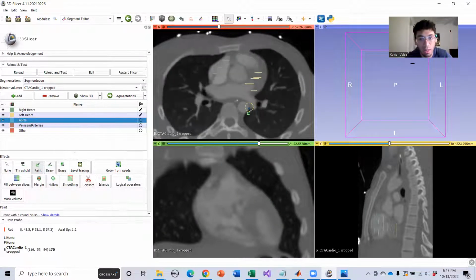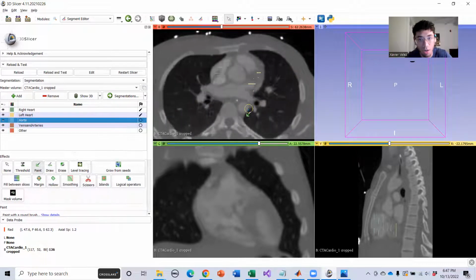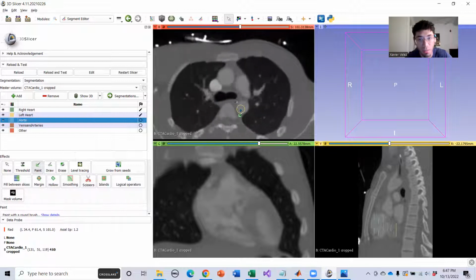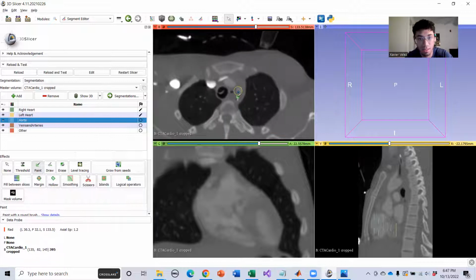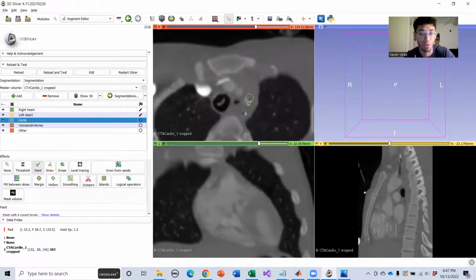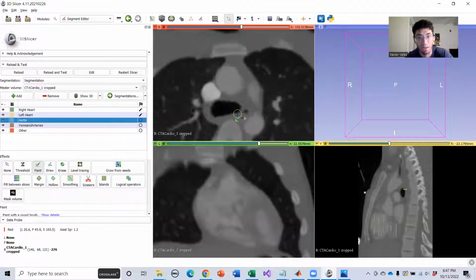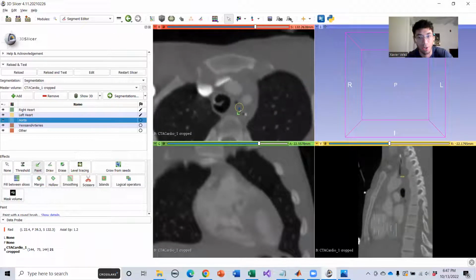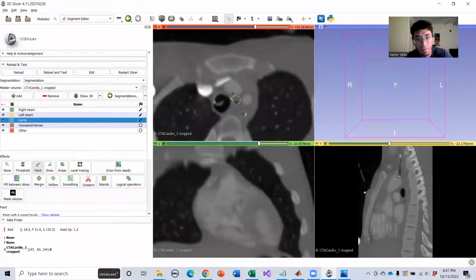And this one, I am actually going to segment up here in this top-down view. So I don't love segmenting in different views. I think it's typically a lot easier to just segment everything in one view. But because the aorta can so cleanly be seen here, I'm going to do it here. So we're going to start at the top. We have this segment here. That's the aorta. So these dots, that's aorta, right?